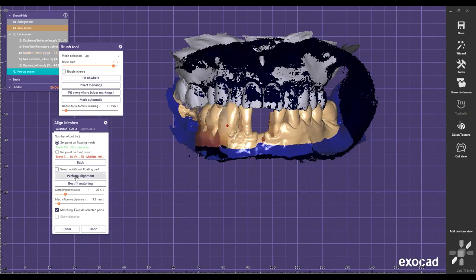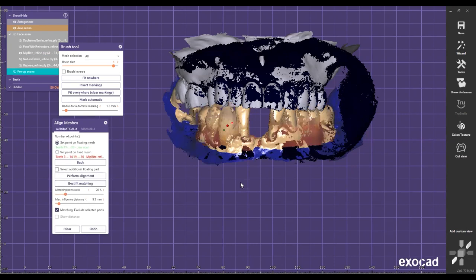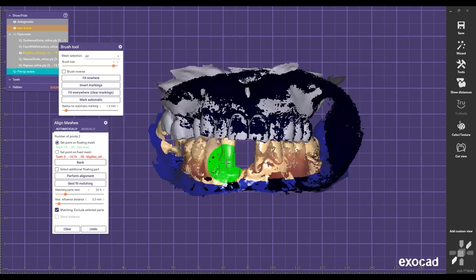So we have to make sure that we get a really good bite, for us to be able to deliver a precise bite the day of surgery. When we deliver the immediate loading all on X, or when we deliver full mouth reconstruction crown and bridge, or when we deliver overdentures, we're able to nail the occlusion because our facial scanner is a bite scanner.